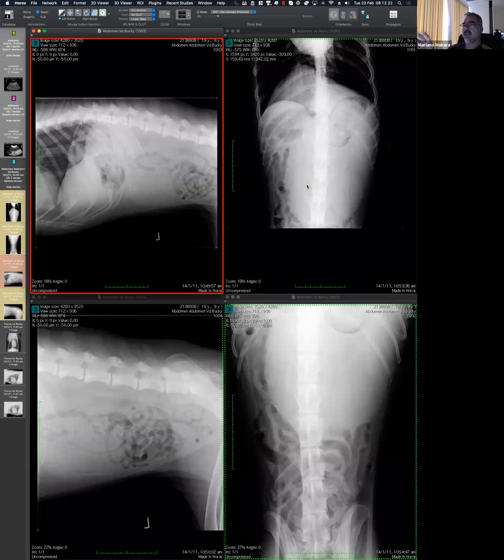And then the other thing that it's telling you is that there's no fluid around the kidney. Because it could be the situation where you have the mass and the mass is producing fluid, and then you will not see the kidney, not because the mass is the kidney itself, but because the mass is producing fluid and the fluid sits around the kidney, and then you erase the kidney. Makes sense? So, based on what you are saying, there are a couple of conclusions. First is that the mass is likely not coming from the kidney. And then I would even add that we can see the kidney in the lateral projection. It seems to be located in the normal position.